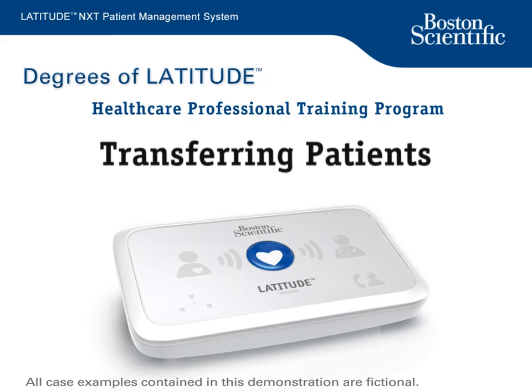As clinical needs change, it may be necessary for patients to be moved to a different patient group or transferred to a different clinic entirely. In LATITUDE NXT, patient moves and transfers can be seamlessly executed once you have the proper patient consent documentation.